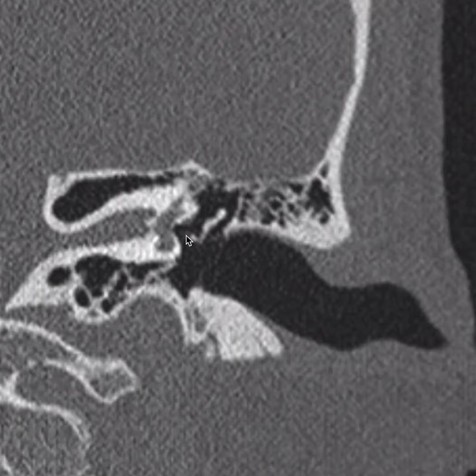which then goes to the neck of the stapes and then into anterior and posterior crura, and finally to the footplate of the stapes. The footplate of the stapes is the part that articulates with the oval window right here. We'll see these structures again on axial CT.